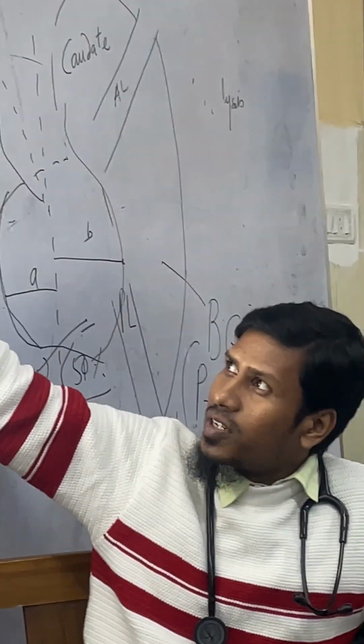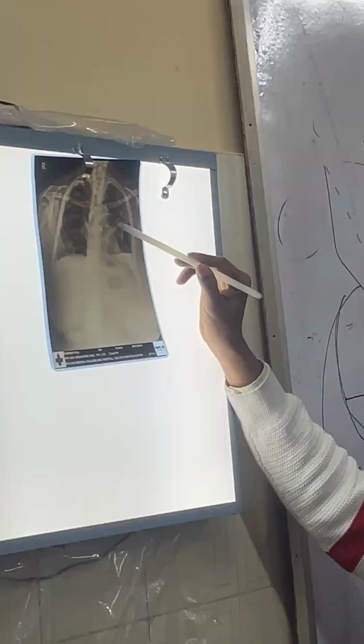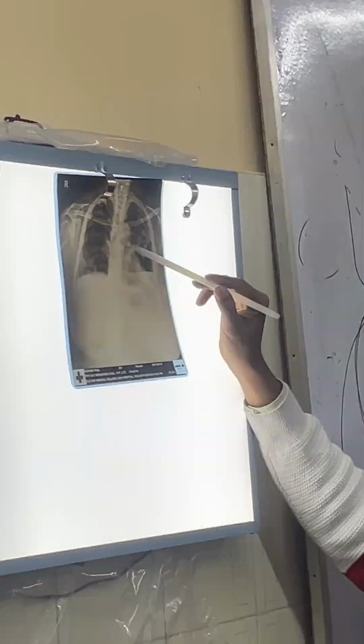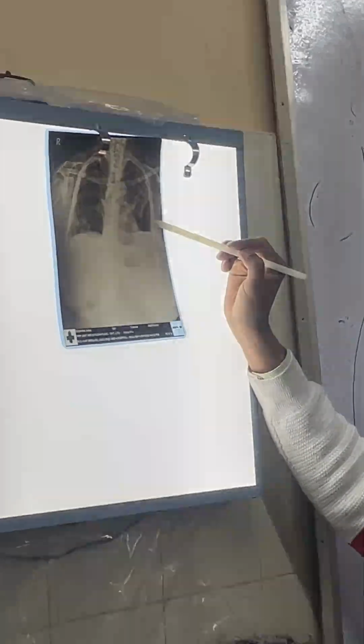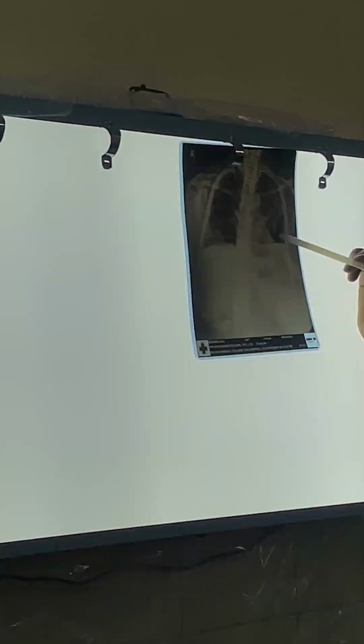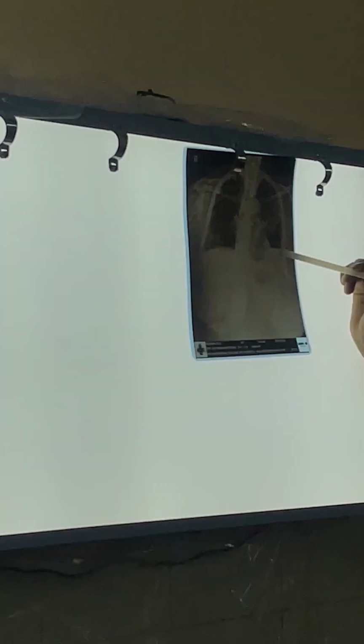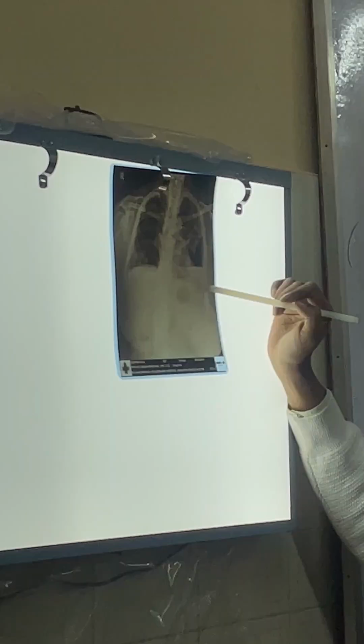This is the margin. What margin is this? It is the pleura. This is the visceral pleura, and there is the parietal pleura. So in between the pleura, if the air is there, this is known as the pneumothorax, and below is the water. How do I confirm water?